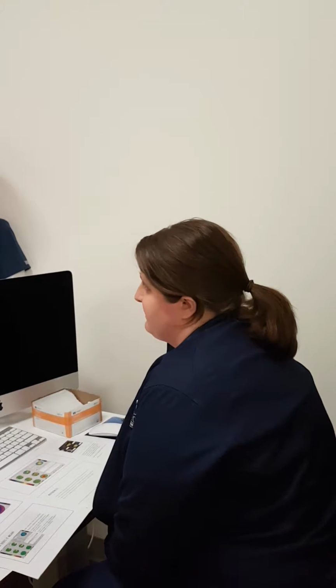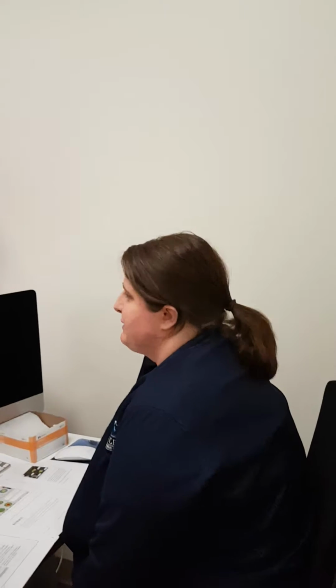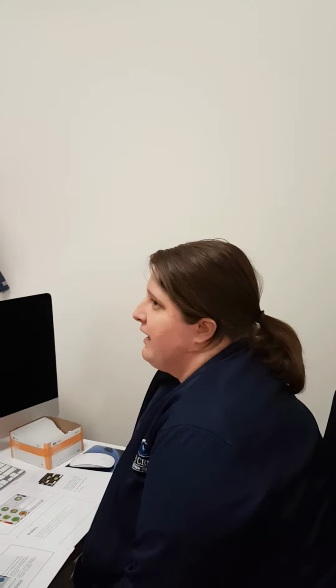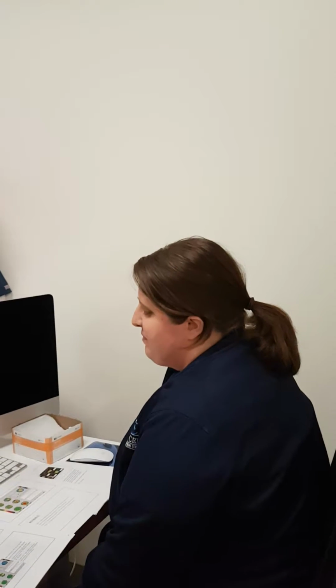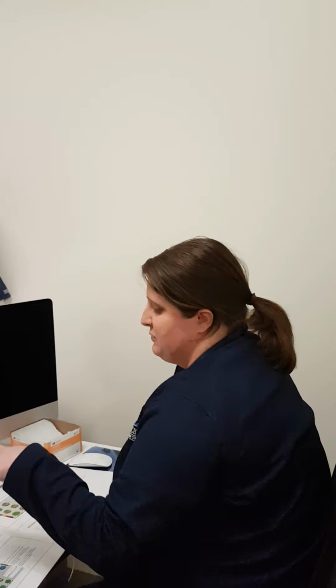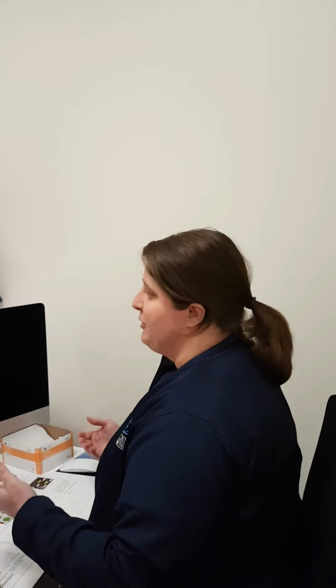The Belin map that we sent is important more so for ectatic disorders than anything else, which is why we don't really need to send it for our routine cataract pre-op stuff. It's more looking into, is this patient at risk for ectasia? Their maps can be pretty normal, or look good, but then we can send this Belin and it gives us a little bit more detail as to is there thinning compared to a normal eye, does this look normal for that patient?